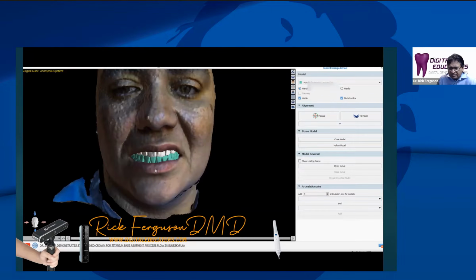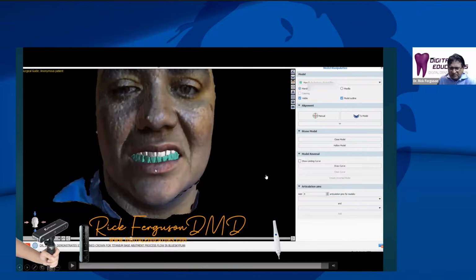In other words, have that roadmap before we even start the case, or have it later on if you've already started the case. Some people like to do freehand surgery and then have a denture that they pick up, and then they could do this technique to finalize that final hybrid prosthesis.